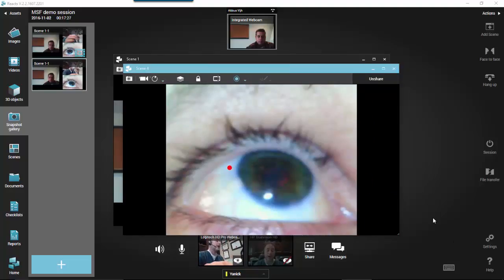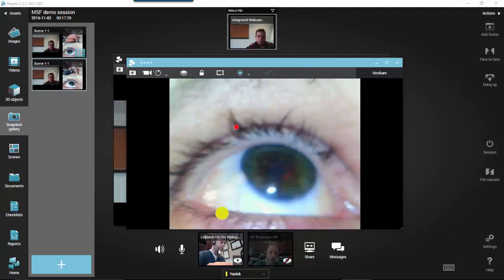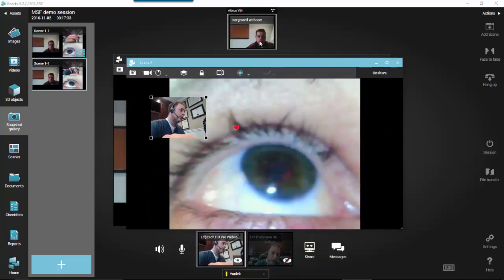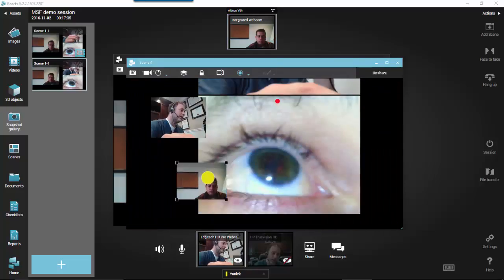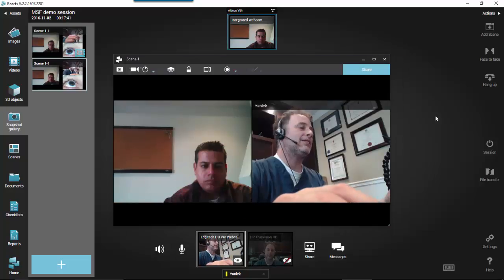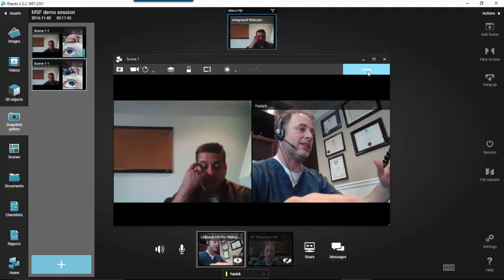I would like to have my live feed. No problem. I'm going to get my camera, drag and drop, and put it inside like this. I could put Al's webcam, drag and drop like this. And now we can both interact on that image. Okay, so now I'm going to close that and reshare the main scene.